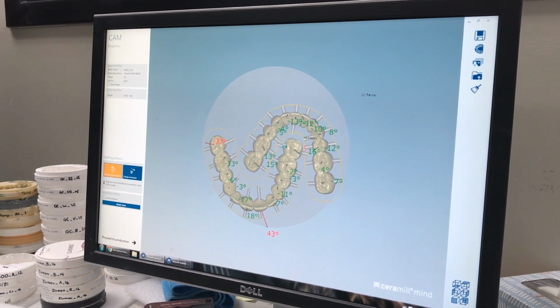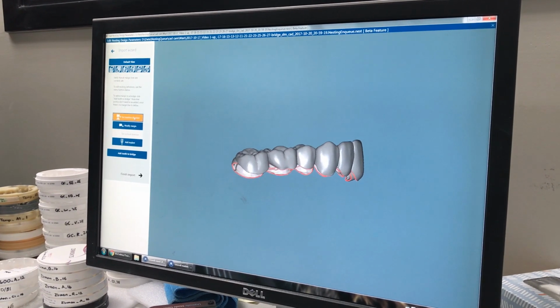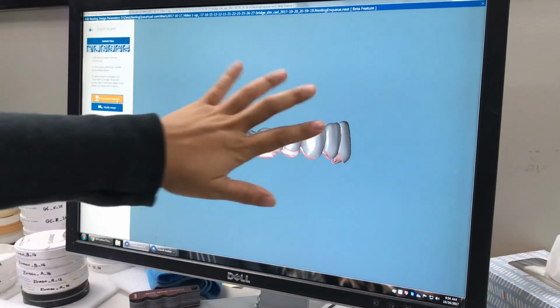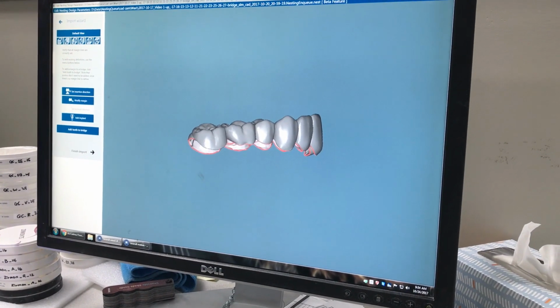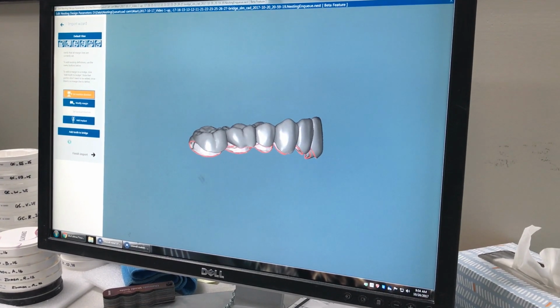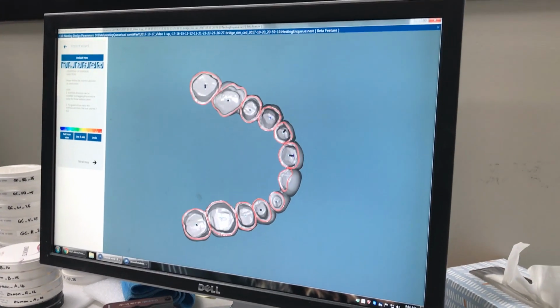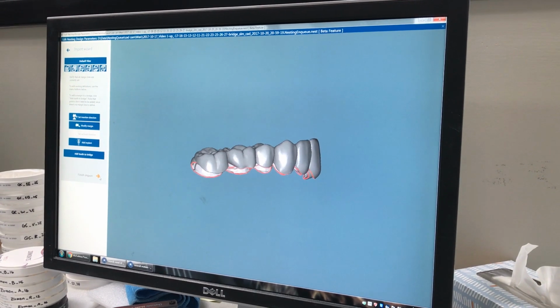So now the wheel of death is turning. Ooh. Okay, what is this, Julie? Earlier you can see a lot of angles like 40 or 42, so I tried to make them lower down. So like the undercut, maybe, or not the undercut, but making sure that the angles are at their best. Milling the insertion direction. Yeah, like milling the insertion direction. Ah, okay. So finding the insertion direction to mill them in the best way possible.